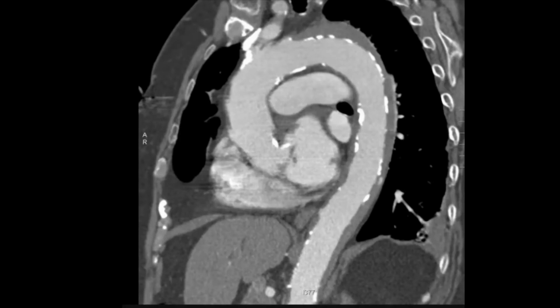Okay, this is an intramural hematoma, pretty extensive. You see the aorta here, and we see this kind of soft tissue thickening along the aortic wall. And what gives this away are these intimal calcifications. If this was regular atherosclerotic disease, the intimal calcifications should be along the wall over here. But this is an example of displaced intimal calcifications, and this is seen in intramural hematoma. We can also see maybe over here a little blood pool of more acute appearing blood right here, so intramural hematoma.